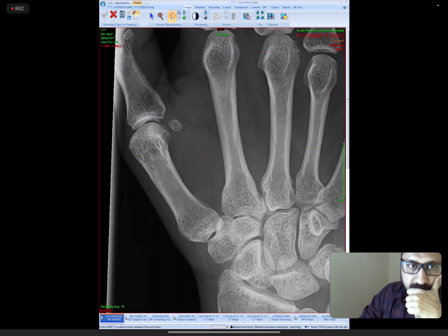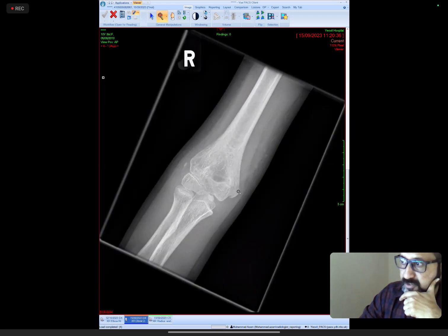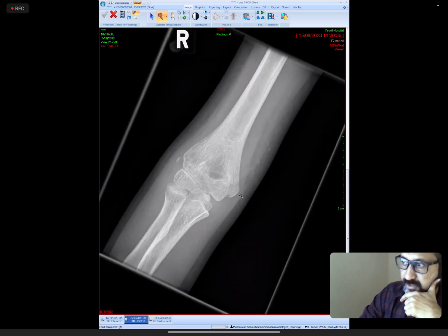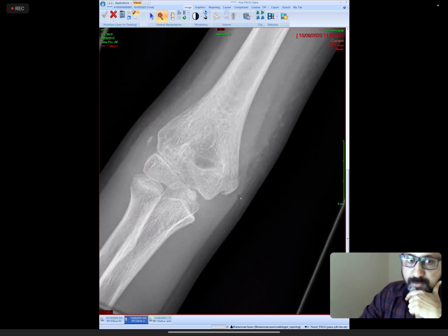Going back to case number 6, that was RR3, and RR3 means this one. Yes, supracondylar fracture with joint effusion or fat pad displacement, you could see here as well. You could magnify, right? So a non-displaced supracondylar fracture. Most of the people got this answer right.